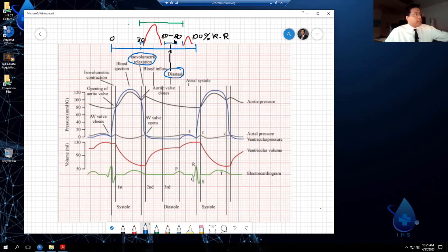I use for the coronaries 60 through 80 on a modern dual source scanner, but on 64 slice scanners, I just tell them, give me 30 through 90, because I want this systolic sweet spot and the diastolic sweet spot on the workstation. Because sometimes the LAD comes in perfect at 60, but the circ will come in perfect at 35. So you have to scroll sometimes through different phases to find different segments. Some coronary segments are out of phase with each other.